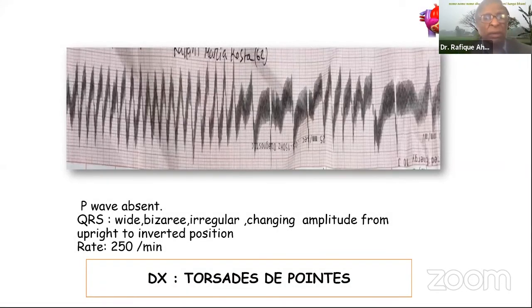So, this is a fairly ugly looking ECG. This was in telemetry? Yes, sir. Yeah, I mean, it's tough to make anything out of this ECG, actually. And the patient was conscious or unconscious? Patient was in an acute confusional state.